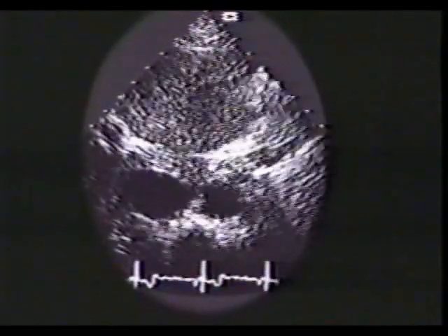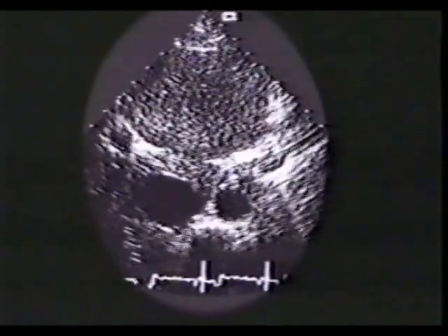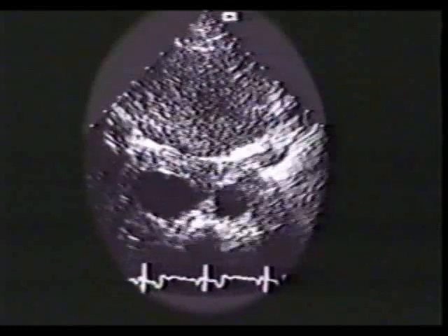In situs inversus, this relationship is inverted, and in some complex lesions, this relationship is altered so that aorta is in the midline and inferior vena cava is posteriorly situated. We next determine the situs of the liver and stomach. In situs solitus, liver is on the right and stomach is on the left. This relationship is inverted in situs inversus. While in situs ambiguous, the liver occupies midline position.